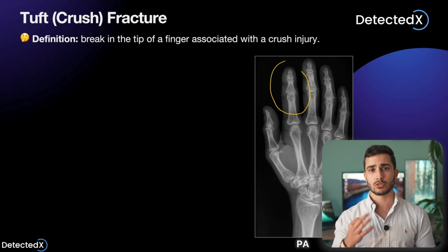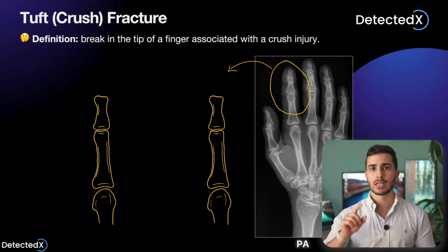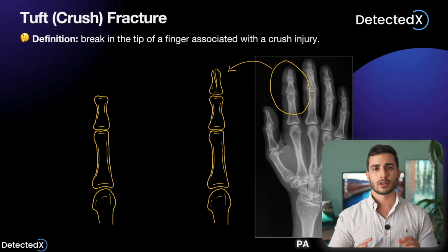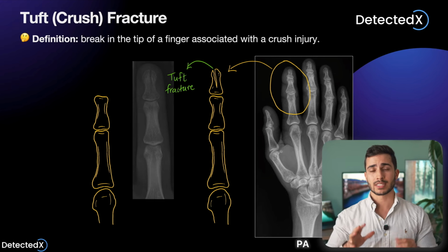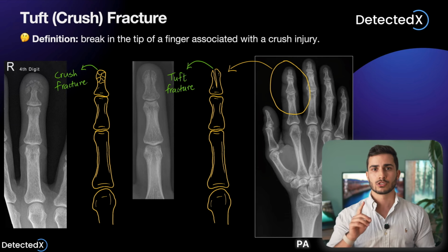The third module talks about the common pathologies in that region, showing what abnormal looks like by taking you through the common pathologies you would expect to see in that region, where the abnormal pathology gets discussed conceptually and then drawn and identified on an X-ray.